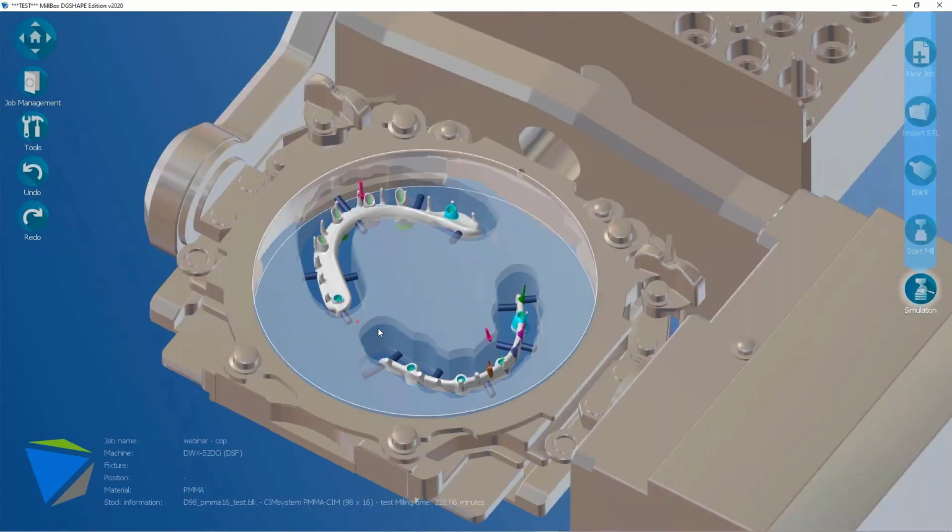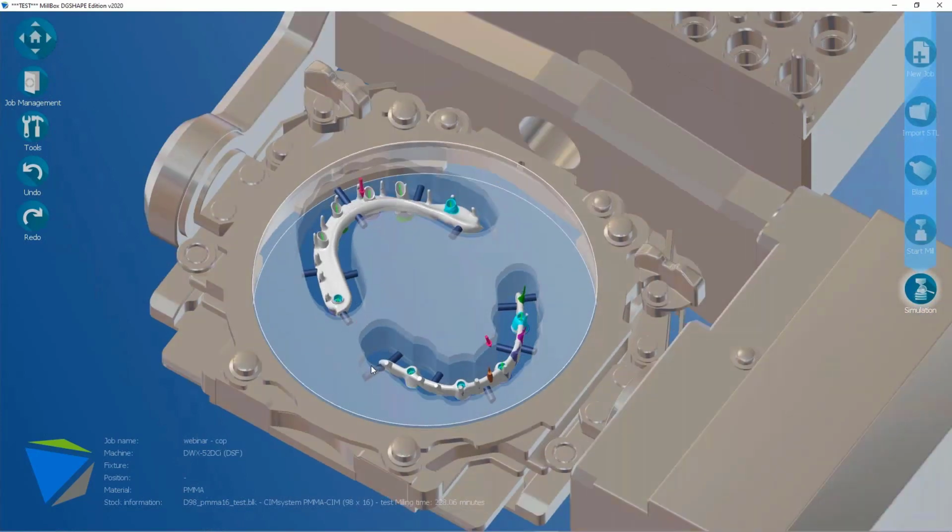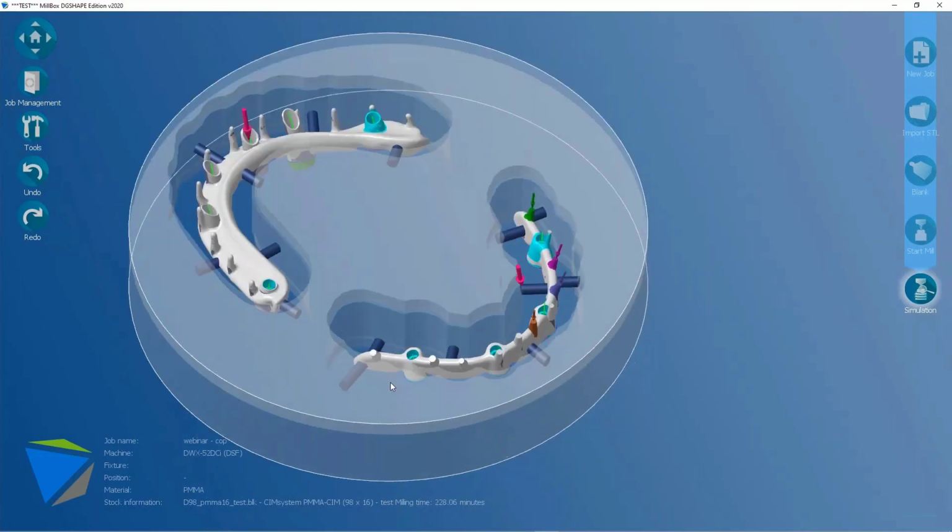But sometimes, because of the particularity of the model of the object you want to mill, it is quite difficult in a standard way to mill all particular crucial parts in a coherent, optimized way.